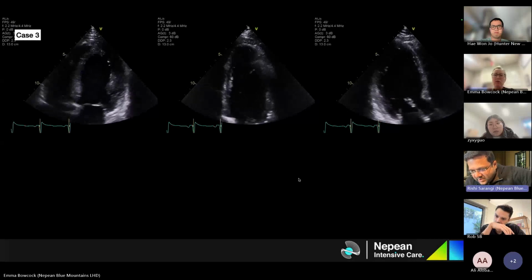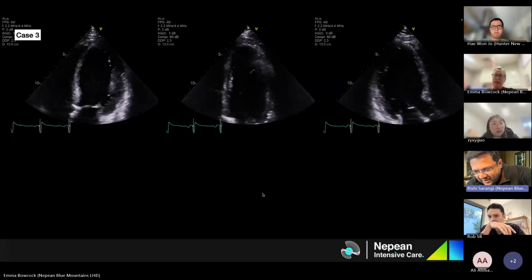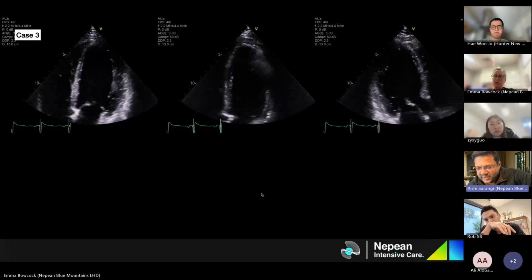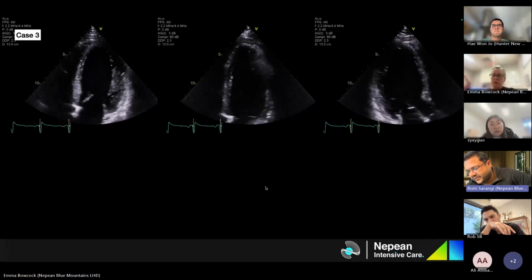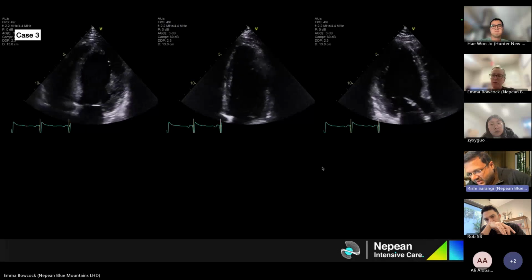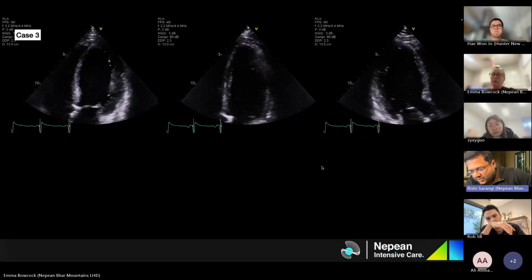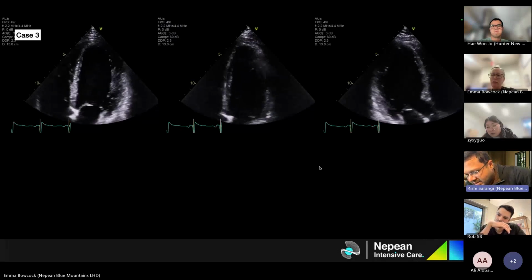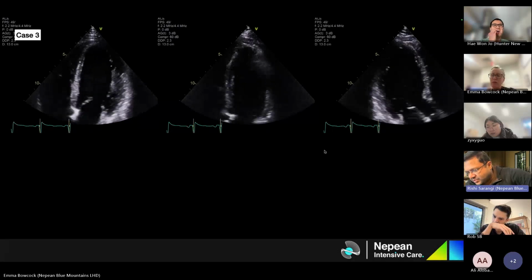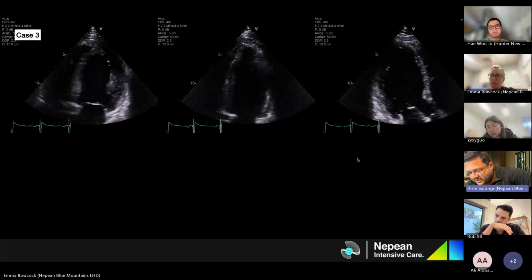And the findings are similar on the 2-chamber views. So looking at the anterior and the inferior walls, there is reduced contractility at the base compared to the mid or apex, and same with the 3-chamber view as well. Looking at the anteroseptal and inferolateral walls, reduced thickening towards the base of the inferoseptal. I can't see properly the apex of the inferolateral wall at this stage.